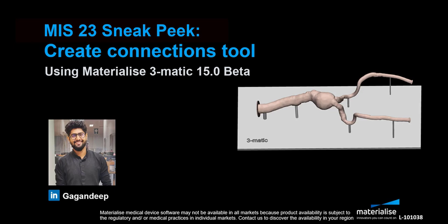Hi everyone. Today I'm going to give you a sneak peek of our new Create Connection tool, which will be available in our upcoming release of MIS 23. This operation allows you to create multiple connections automatically between the several paths.